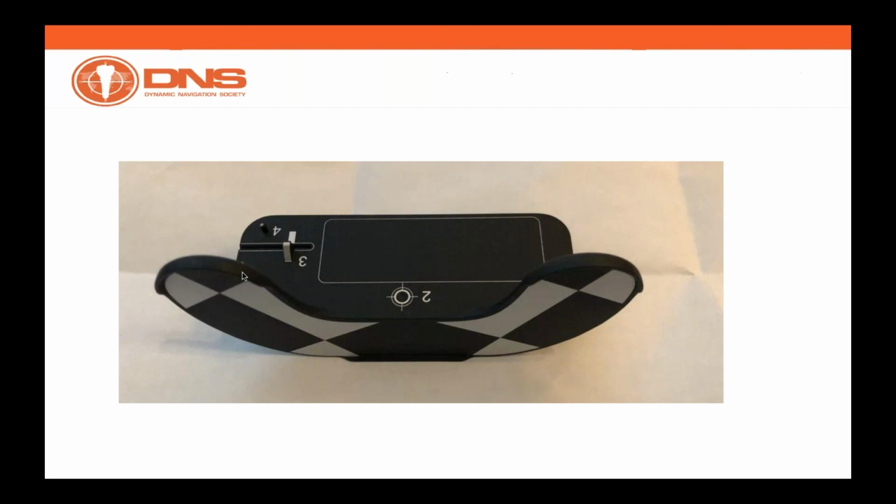We're talking about a metallic tool, which is very helpful to communicate with the software which kind of tool we are using at the specific time. And you can see there's a certain amount of numbers. You can see here number 2, number 3, and number 4. Those numbers hint to the type of tool that we're going to be using.